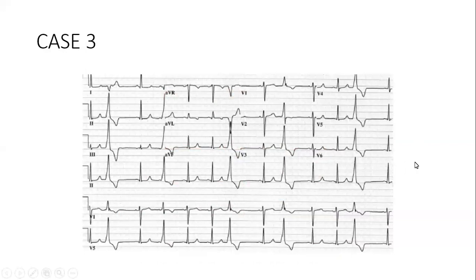Again, you're going to go do your preoperative evaluation on a patient, and then this is the ECG you see. A 60-year-old patient coming in for some elective surgery. This is the ECG you see. What's your spot on diagnosis? Irregular rhythm, so I would go with atrial fibrillation.